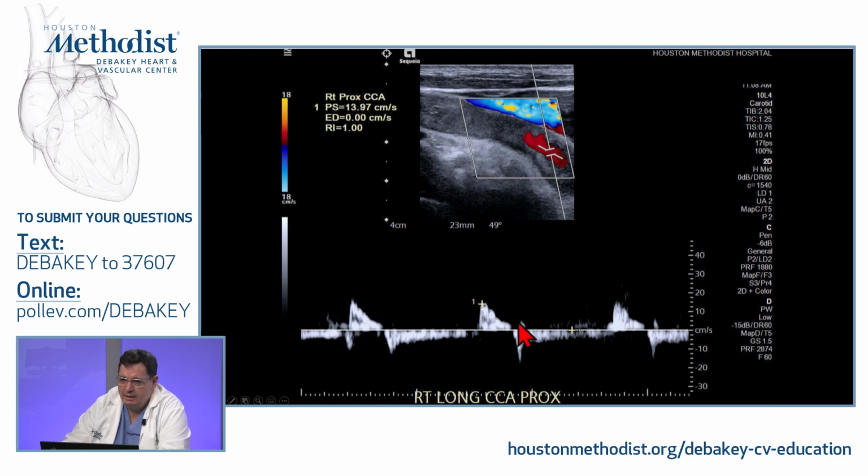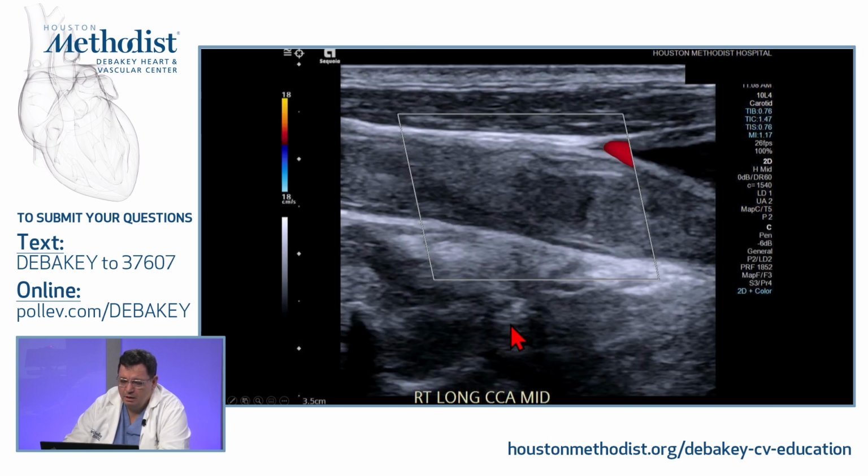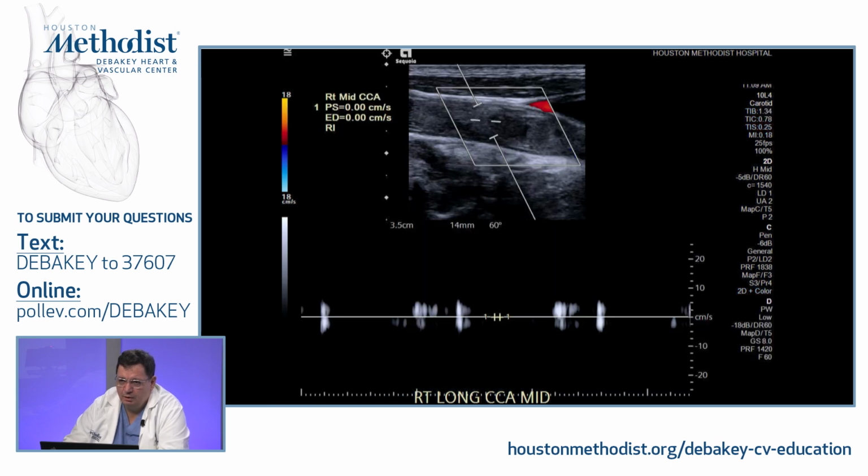So almost like that Galveston Bay or whatever happened on the weekend, that all the water disappeared from the bay. This is what it is, that in diastole it is still draining out all the blood flow that went up in systole. And again, here's your aortic valve closure. So not much flow in the common, and it's interesting that again the scale is dropped further to 18.